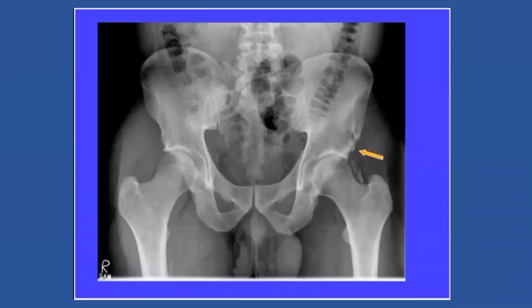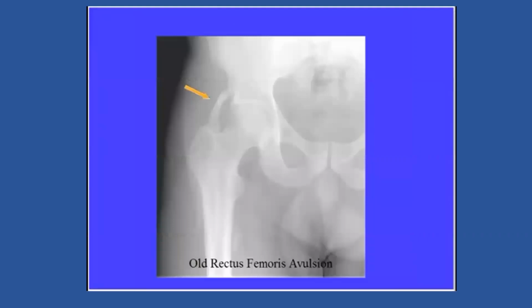Let me tell you, this has been an ancient rupture of the rectus femoris. You can confuse it, and it was confused with an enchondroma or an osteochondroma. And the patient was followed up each year with x-rays, being that osteochondromas of the proximal end have a higher incidence of change into tumors. So you have to keep this in mind. You should not confuse this. You have to know that the rectus femoris arises from there and you can have an avulsion. Please don't forget this. This is another case where they develop like an osteochondroma, and you can confuse this. Please keep this in mind.